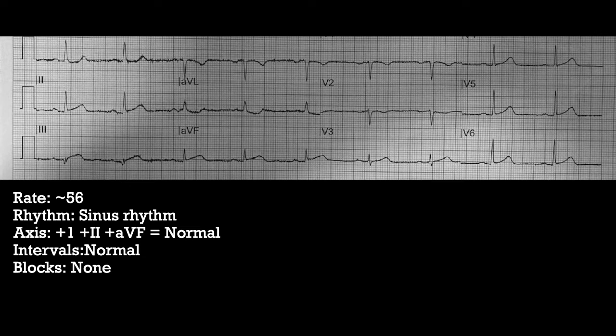When we look at the lateral leads here, here's the segment that we're going to compare it to. It looks like the ST segment is maybe down a little bit. It might be just a little bit of an optical illusion, but it looks like the ST segment is maybe a little bit below the line between the T wave and the P wave there. Probably so. And then when we look at lead AVL, it looks like there's some definite ST depression there.